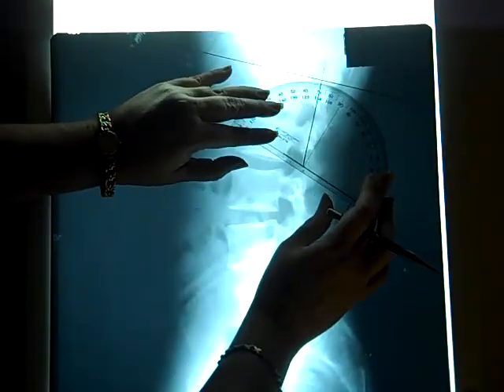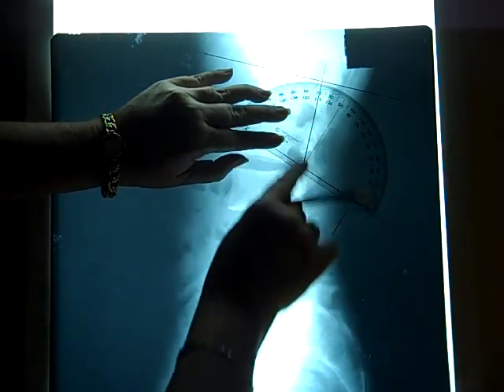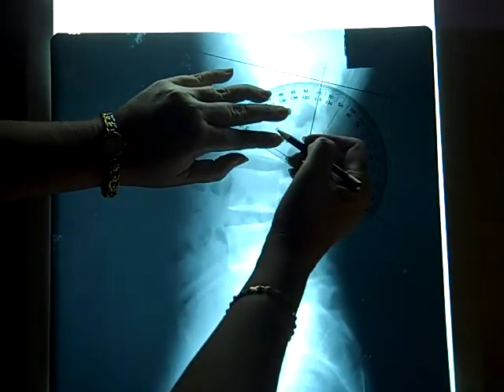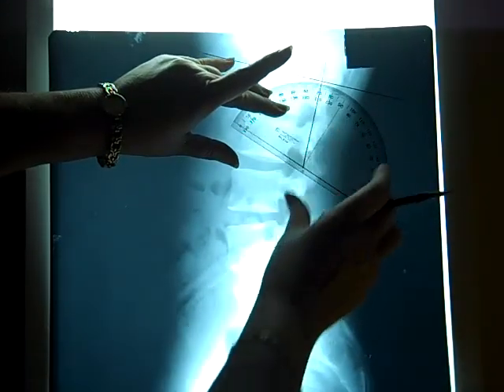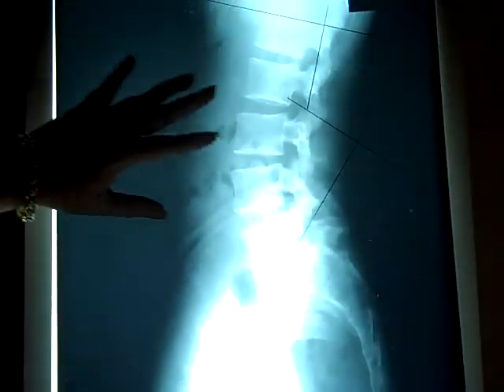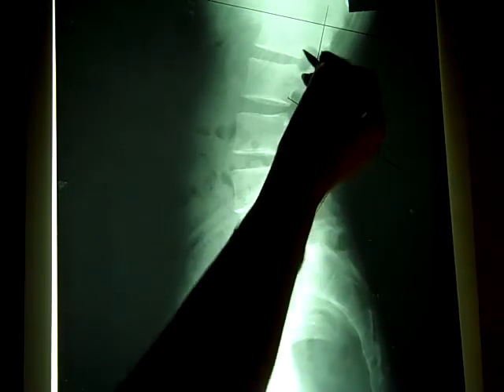these two lines. Put the base over one of the lines, put the hole of the protractor at the junction of these two lines, and I measure the angle right here, and so from here to here is an angle that measures about 70 degrees. And so normal range for a lumbar lordosis is 50 to 60 degrees with an average of 55 degrees. And this one is measuring 70. Again, we're measuring the angle right here. And this one happens to measure 70 degrees.